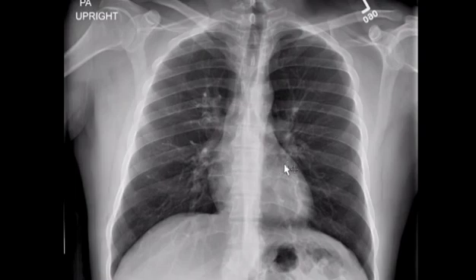Alright, so the next thing I do is go straight to the bones. And I know it's weird, but I've seen so many missed fractures on a chest x-ray, and I don't want to miss those, so I go straight to the bones to make sure I look at them. So what I do is I start up at the right shoulder, so I take a look at the right humerus, on into the glenohumeral joint, follow down the scapula, take a look at the distal right clavicle down to the sternoclavicular junction, follow it onto the left clavicle down distally, take a look at the scapula into the glenohumeral joint on the left, and any portion of the visualized proximal left humerus.